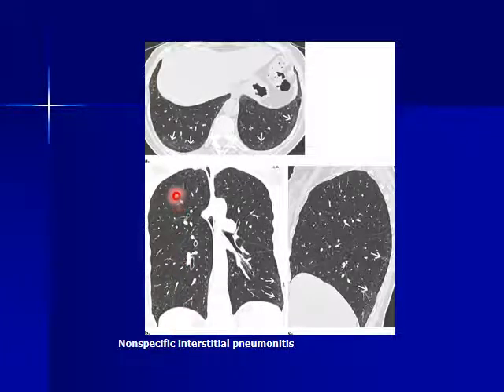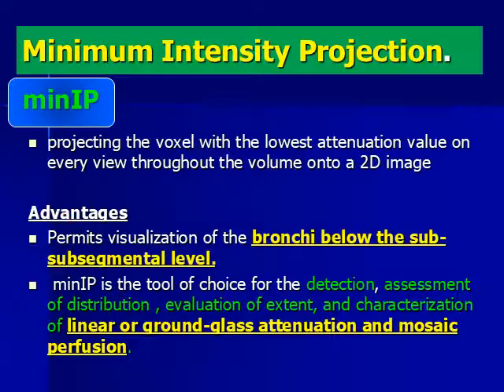This is very important because with these three orientations, we can exactly know the anatomy of the lung using the fissures. As you see, this is the major fissure and the transverse fissure, and we can tell where exactly the lesion is, because the surgeon wants to know whether I am going to do a segmentectomy or lobectomy and so on.